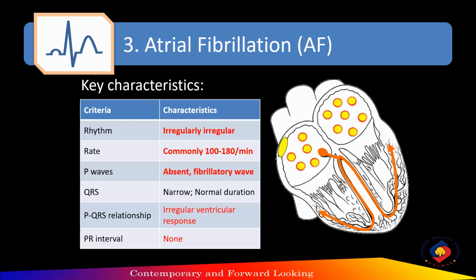Atrial fibrillation, which is also called AFib or AF in short, is characterized by disorganized atrial electrical activity and contractions. In AF, irritable foci all over the atria cause rapid action potentials that result in rapid atrial rates of between 400 to 600 beats per minute. These erratic impulses cause the atria to not be able to contract normally and only shiver or quiver, thus the term fibrillation.